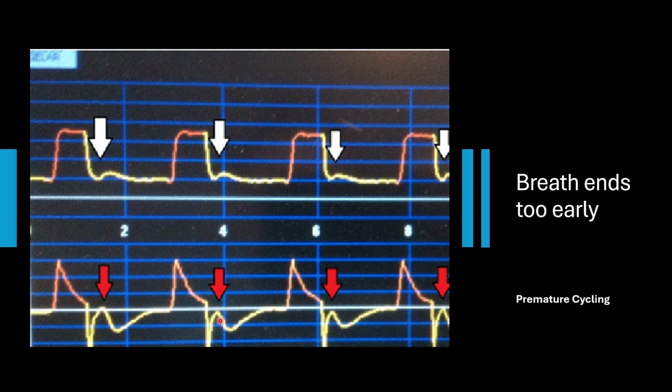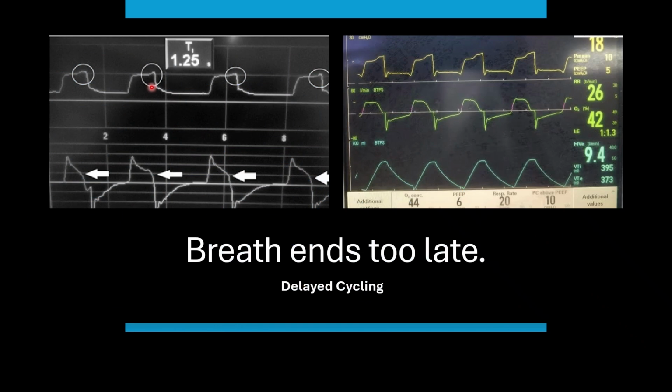So this situation can lead to high tidal volume generation despite the shortened inspiratory time because of a second breath which can occur, or double triggering, or even reverse triggering. There could be high tidal volumes and breath stacking. And now here again, see, better to see this part of the curve, or even here also what is happening.